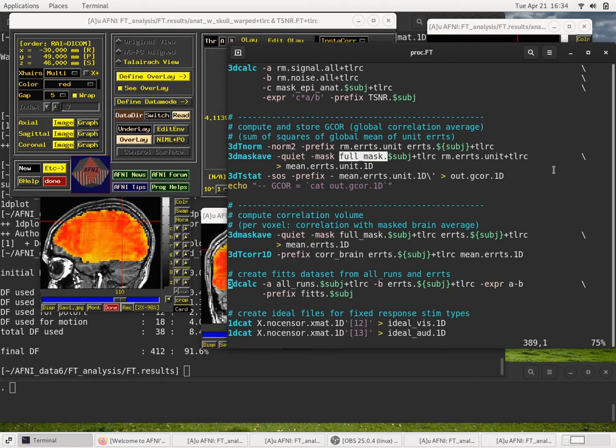So this is a huge number of voxel pairs. Fortunately, correlation is a linear computation, so we can scale the residuals by the variance, making the variance equal to 1, scaled down so that they're unit vectors. So the sum of the squares is 1.